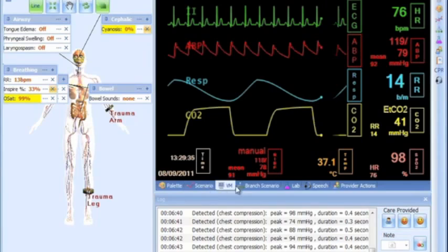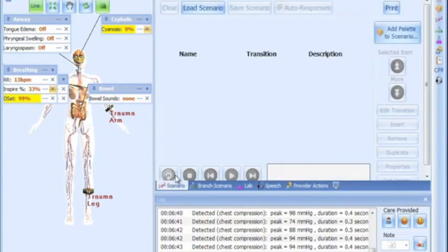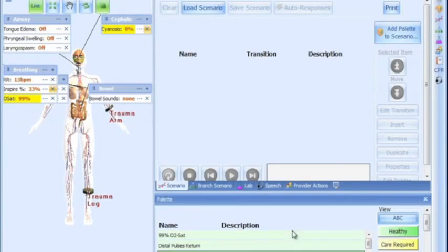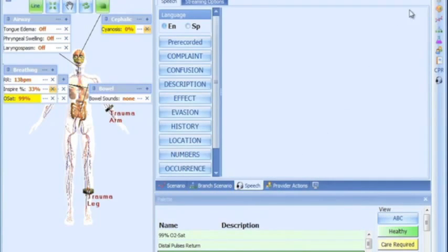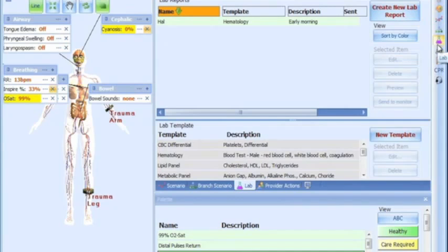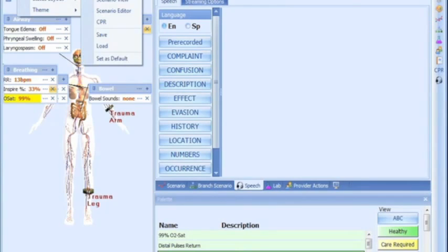As mentioned before, the Giga interface is configurable by the user. Tabs can be rearranged. They can be undocked and redocked at a different location, or they could be closed and reopened at any time. Once the layout has been changed, it can be saved or set as default.